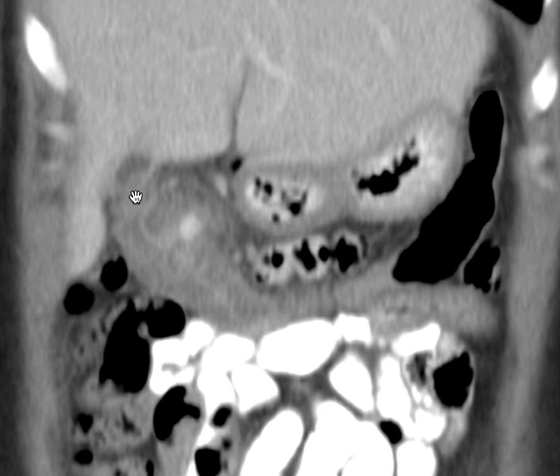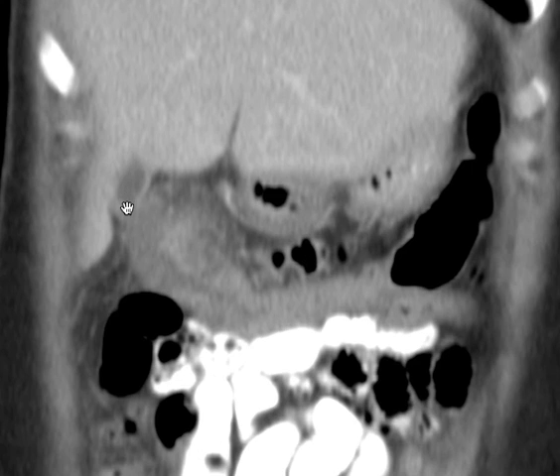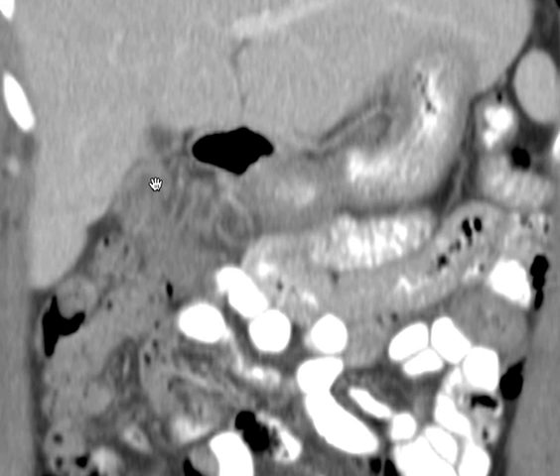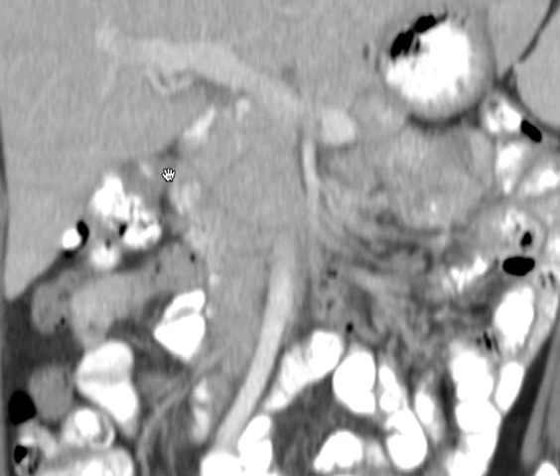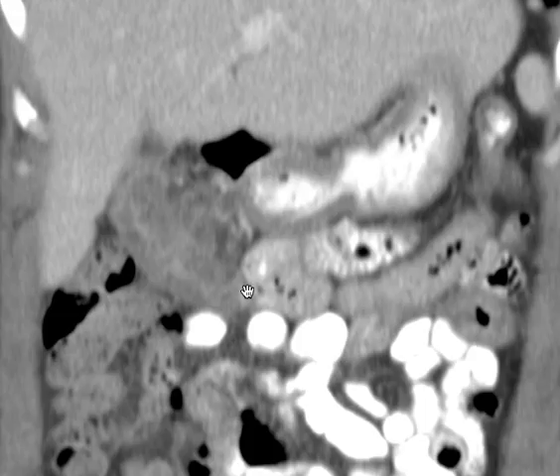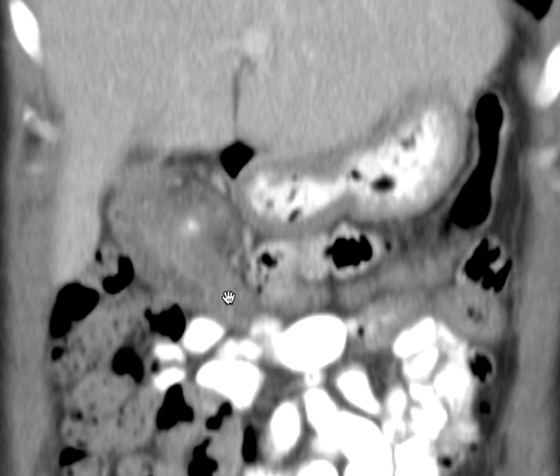And more proximally, it is the distal hepatic flexure. So it goes from the distal hepatic flexure, and it's not a very clear demarcation between those. It goes from distal hepatic flexure into the proximal transverse colon, and that's what we're seeing here, transverse colon.